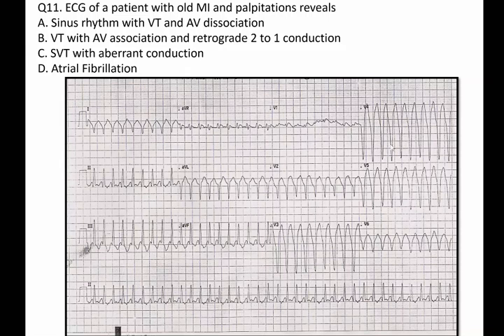If I were to ask you what is the QRS duration in lead V4 or V5, nobody will have doubt that it is a wide QRS tachycardia. But looking at lead 2, I think most of you will say that this is a narrow QRS tachycardia. So this is a wide QRS tachycardia with small signals in lead V1, which is not very clear whether it is negative or positive. But let's believe that this is negative. So you have negative QRS complexes from V1 to V6, which is negative concordance, suggesting ventricular tachycardia as a diagnosis.